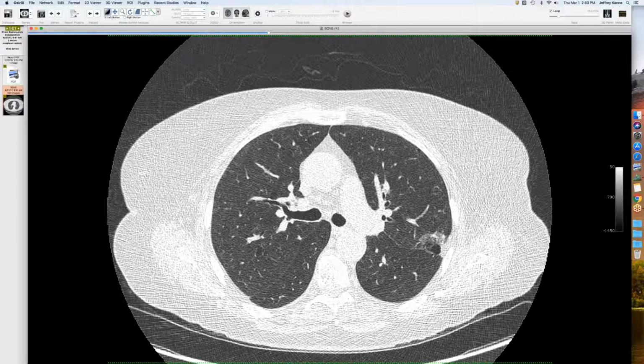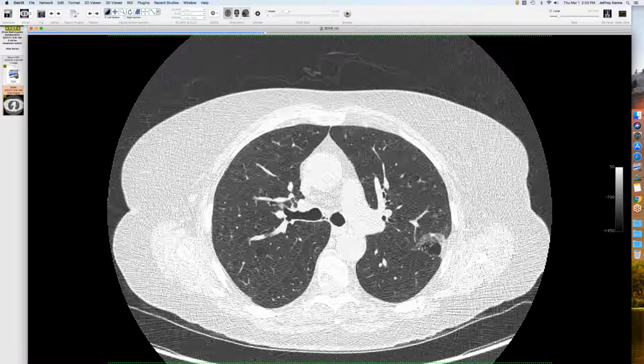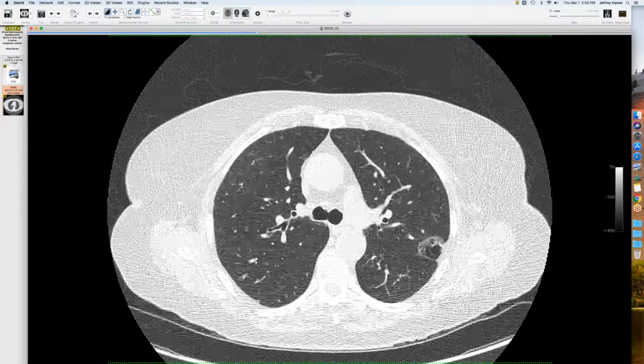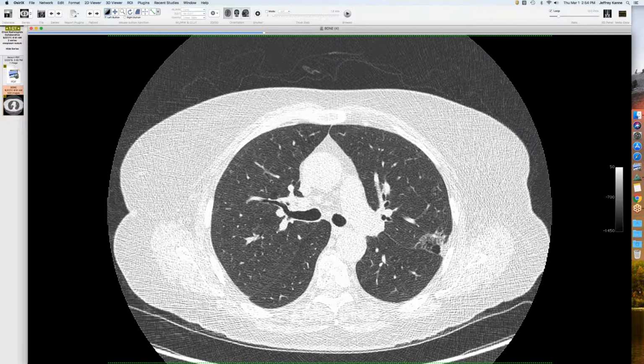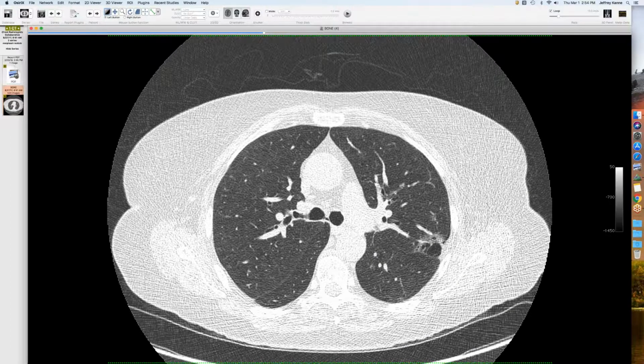And we all know when we see the cystic component, the likelihood this is an adenocarcinoma is really high. And also when you have air bronchograms, we know that. So this was called a 4X, and the X factor is, of course, features that make the radiologist more suspicious that it's a cancer. I don't think anyone would doubt this is a cancer, but it's interesting they don't address this in Lung-RADS, but they took it out, I think appropriately so.